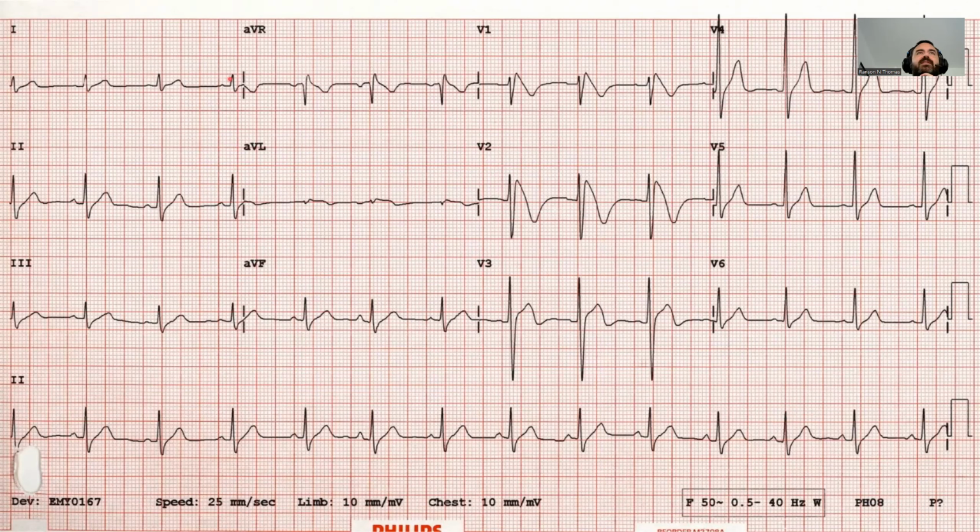This is one lead, right? You can even see where it has the little hash mark breaking it off. This is one lead, this is another lead, this is another lead. This is the start of this lead, and it goes to here. This lead, this lead. You see now we're starting V1, this lead, this lead, this lead, V4, this lead, this lead, this lead. Does that make sense? So basically we have 1, 2, 3, 4, 1, 2, 3, right? 4 times 3 is 12.